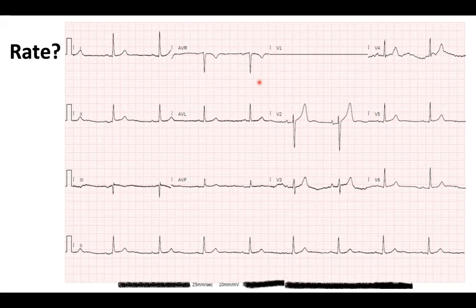Yeah, and we've got answers from lots of people: 50, 48, 48, 50, 48, 50. Yes. So well done. If you use the standard lead 2 at the bottom, you'll get an answer of 1, 2, 3, 4, 5, 6, 7, 8. So 8 times 6 is 48. And then this will underestimate slightly because you've missed this one complex, which you can't actually add in. But as I said before, it doesn't really matter.